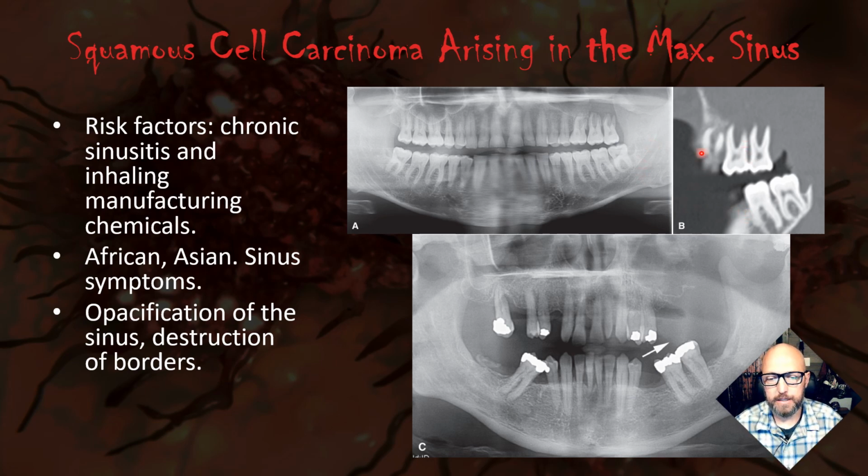Here's a cone beam CT of the same case. We really have the teeth floating in air. This looks so much like a case that I saw where the dentist did not diagnose it because they didn't know how to diagnose cone beam CT. It was really sad because it should have been treated a lot earlier in the patient's life, but within just a couple of months, it had expanded all the way up into the patient's orbit. Very poor treatment, I think.